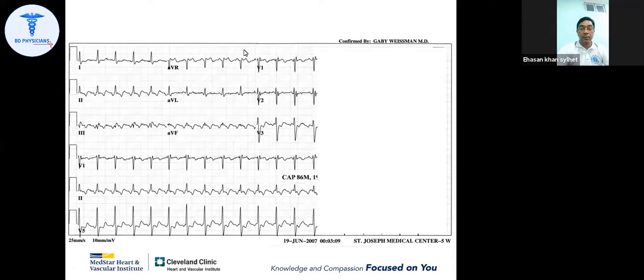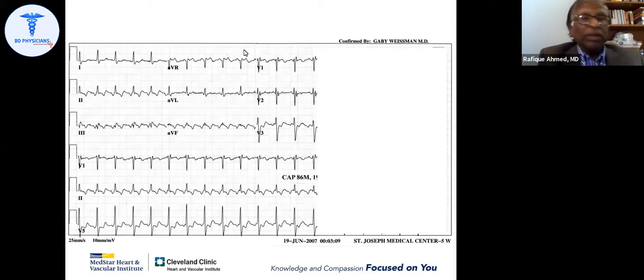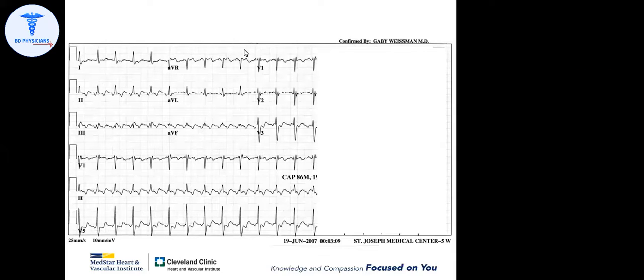Assalamualaikum, sir. I'm Mohammed Saifur Rahman. Okay. So I'll give you the heart rate is around 125 beats per minute. So this, sir, is definitely tachycardia, right? Right, sir. So now the question is, what is it? After the heart rate, we check the rhythm, and the rhythm appears regular.